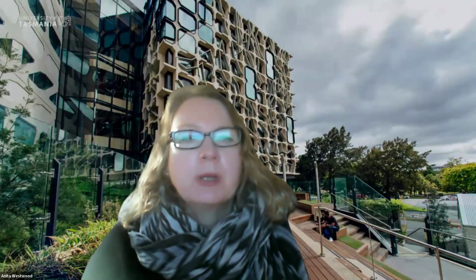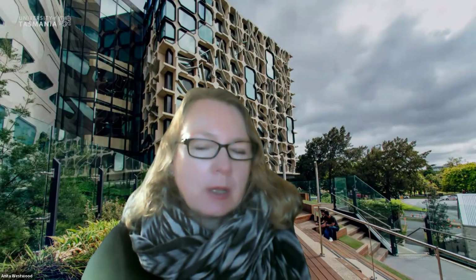No, I only just support what you said. Different machines will be calibrated differently, and they usually come with a manual, and they'll usually have that highlighted. So just to make sure it's diagnostic, this is one of the checks you do. Make sure of limb placement, but also bandwidths in hertz, paper speed, all that sort of stuff, which I'm sure we're about to talk about. It's just another check to ensure that the machine is diagnostic, so therefore you can interpret the ECG.